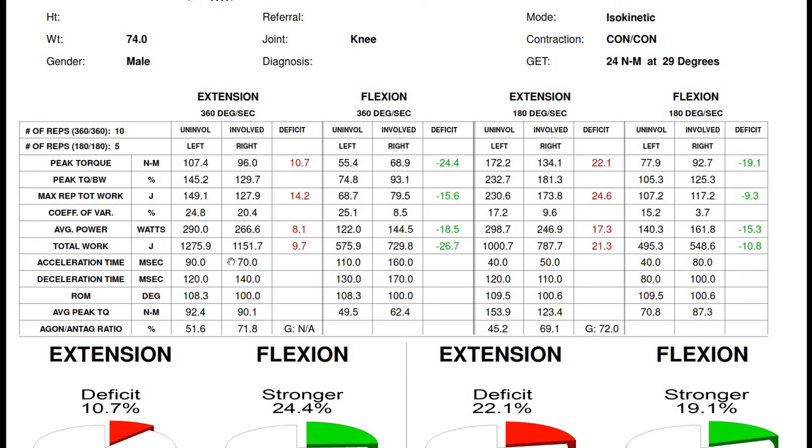See now, instead of a 0.02 second deficit, we now have a 0.05 second deficit, which again is not a value that you can, in terms of addressing the balance, there's not much you could do, but it is still there, and it is something to be conscious of and that you would want to check throughout the rest of the report.